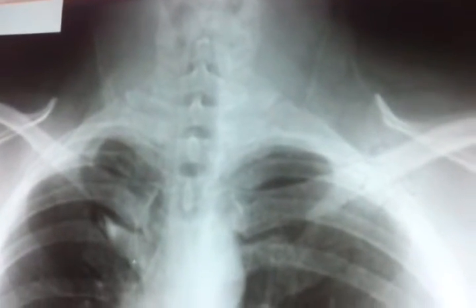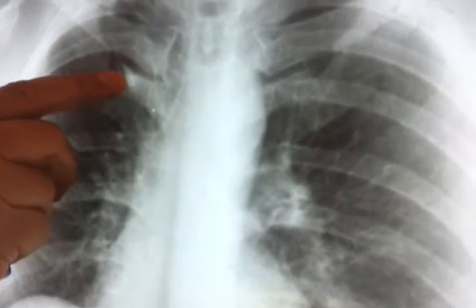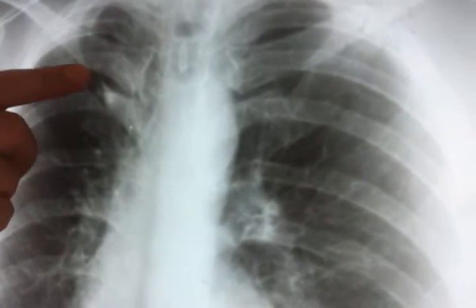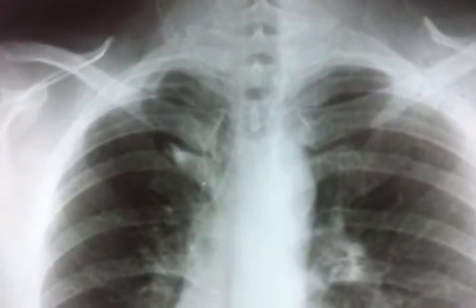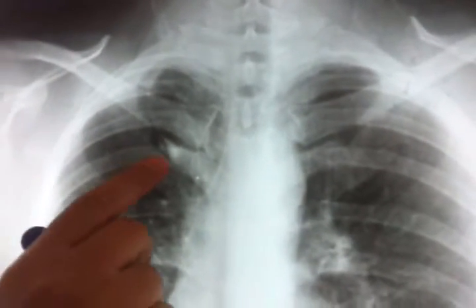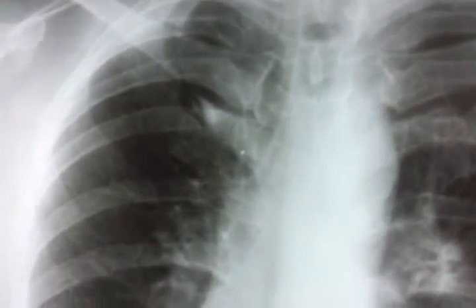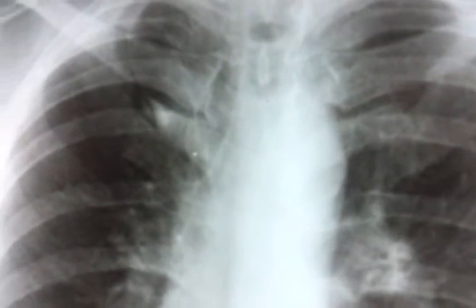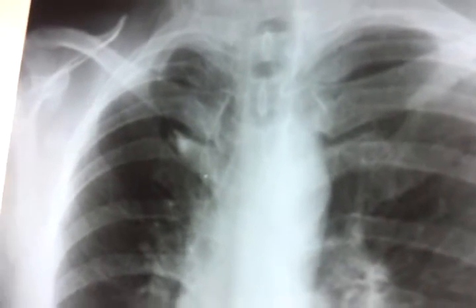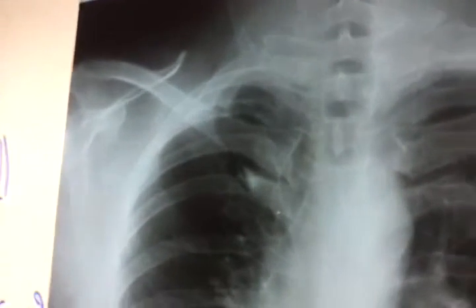There is an obvious lesion, spot diagnosis. Look for this white line. What do they call this? This is what I call an azygos fissure. An azygos fissure is rare. The prevalence of it is less than 0.1% of chest X-rays. It is of no significance usually, but it might show some diseases specific for an azygos fissure.